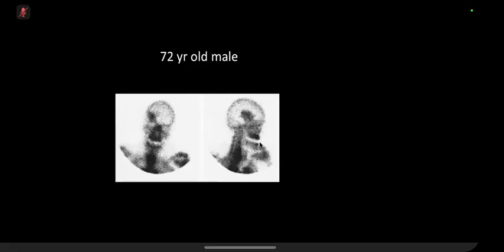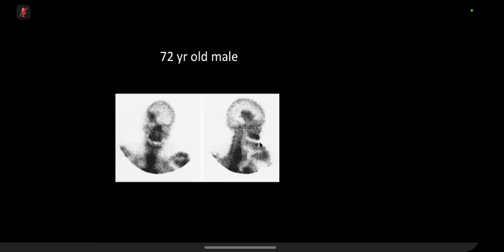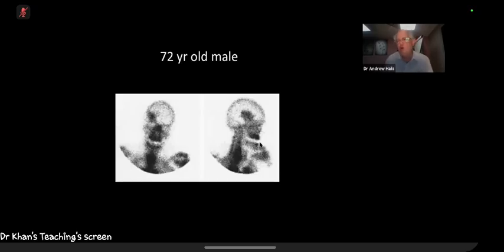So a solitary rounded lesion like that, potentially a plasmacytoma. For a 72-year-old, an LCH-like lesion would be less likely, as that would be more for a pediatric patient. But yeah, metastasis. Paget, but I think Paget is more diffuse rather than a circular focus, when I've seen it, but it could be. Pagets would tend to involve a whole bone, wouldn't it? Or a whole skull, yeah. So probably not Pagets. You said plasmacytoma. Could it be that?